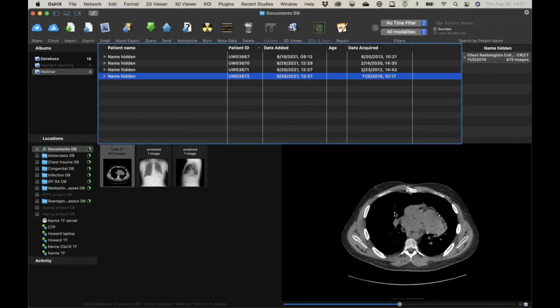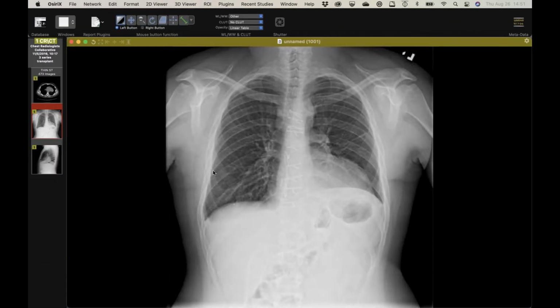All right. Speaking of heart transplants, this is kind of a fun case, something you probably won't see very often. So this is a young man, and I believe I actually showed his pre-transplant CT. I want to say back a while ago. He was transferred here for acute PE and asthma a long time ago, but we looked at his imaging and determined he had CTEPH, really bad CTEPH, like with cor pulmonale. I don't have his pre-op imaging merged in here yet, but I believe I showed it. Anyway, really bad CTEPH. We were going to try to get him to San Diego, but he was too sick. So we did a transplant here.